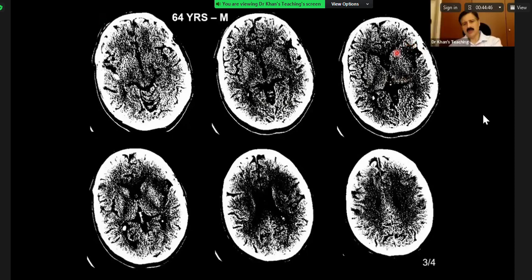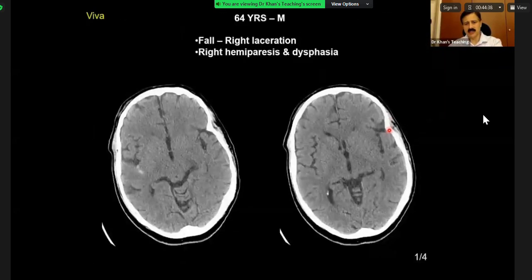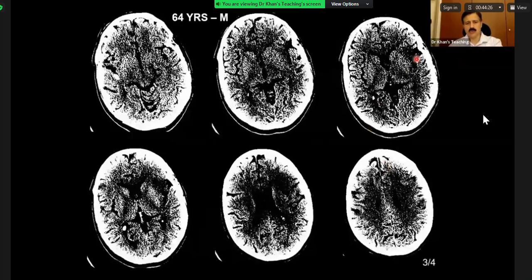Yeah, here you are. Again, you can see the beauty of this stroke window, which increases your confidence. But having said that, if you see here, this was the insula, and one can argue that the same thing is visible without the stroke window also.